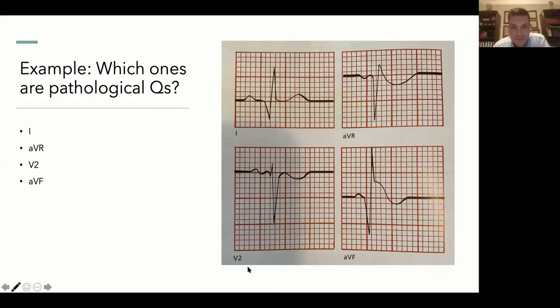Yes, but there's something else as well. If you pay close attention, this is the Q wave of the QRS complex, not this one. This is the S wave. Do you see it? You see, the first negative deflection after the P wave is the Q wave. The second one will be the S. Okay, it is a trick question, but you can actually get this.